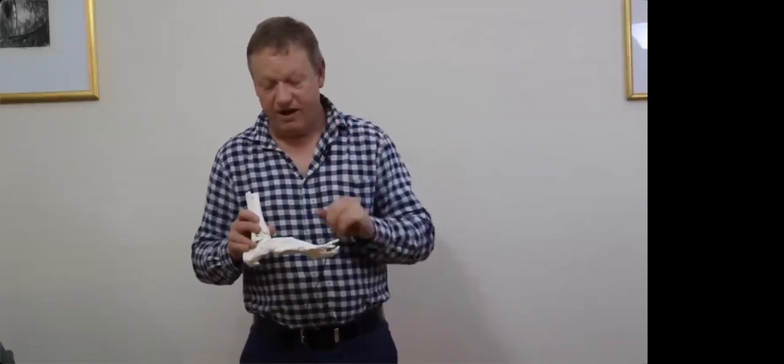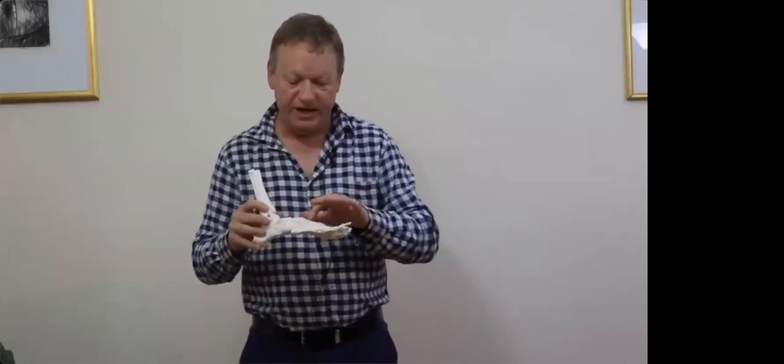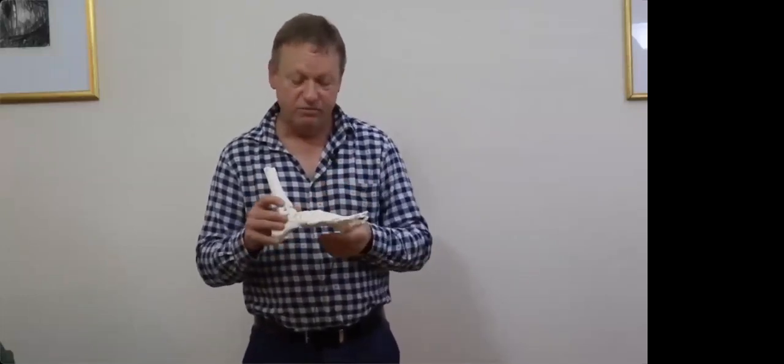The fifth way that we can fail is a disassociation of the forefoot from the midfoot. Now, the forefoot, of course, is made of the 5 metatarsals and the associated phalanges, and the midfoot is made of the cuboid, the navicular, and 3 cuneiforms. Now, if you look at the medial aspect of this foot, you'll see how short that first metatarsal is. And this is not by accident. It's much shorter than the other metatarsals.